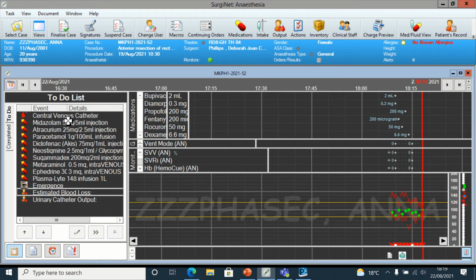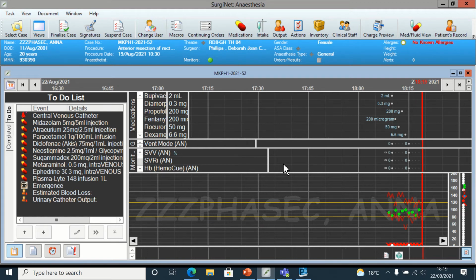The thing about this is once you start this as a macro, the arterial line is one of the things that is automatically triggered in this major macro. So the arterial blood pressure automatically gets monitored on that. So this one that's showing is diastolic because these are the arterial ones. That's what it looks like. These ones will come up automatically. So you don't have to do anything if you use a macro. That's a good thing about using a macro.